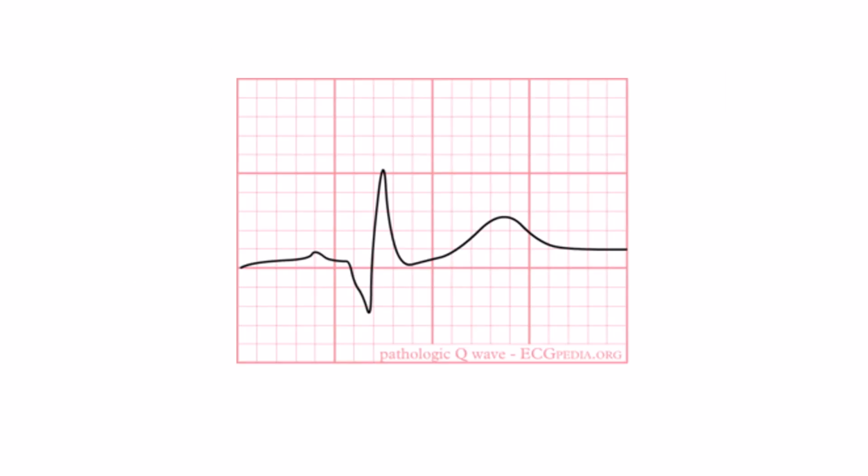depolarization. As we said, this is a pathological Q wave in which the depth is more than 2 small squares or more than 2 millimeter and the duration is more than 1 small square or 0.04 seconds.